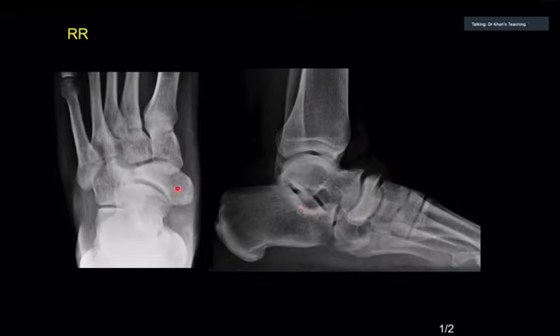Navicular. So what's happening to the navicular? There is like an extra bit medially that is not normally there. So what has happened? I think that could be congenital. Right. If you see here, this is sclerotic as compared to this, right? Yes. So these are secondary changes.